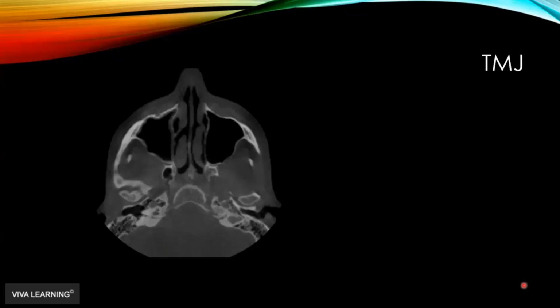This is the temporomandibular joint. I just quickly want to show you this. We're kind of right at the level of the temporomandibular joint. This is the external auditory meatus. These little guys are the tip of the coronoid process. And here's, as I said, the EAM. The temporomandibular joint on this side looks nice and smooth. It's got a thin corticated border. It looks fairly normal in size and shape. On the right side, though, it's very sclerotic.